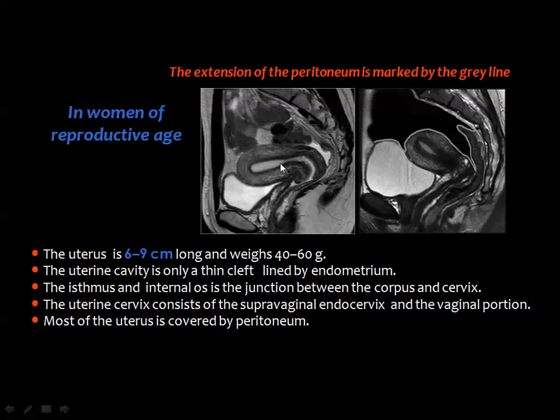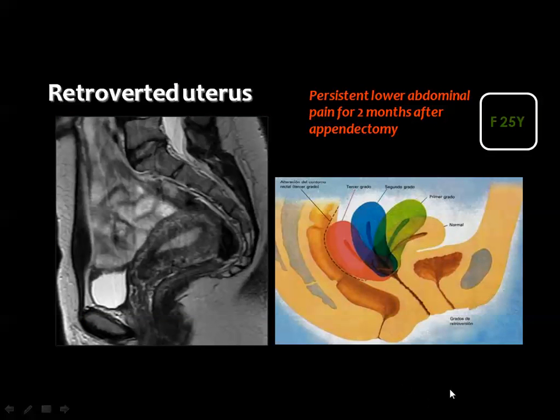And you can continue into the cervical canal, and this is the upper part of the vagina. You know that the uterus is an extraperitoneal organ. It is covered on its surface by the peritoneal cavity, which also covers the urinary bladder vault.